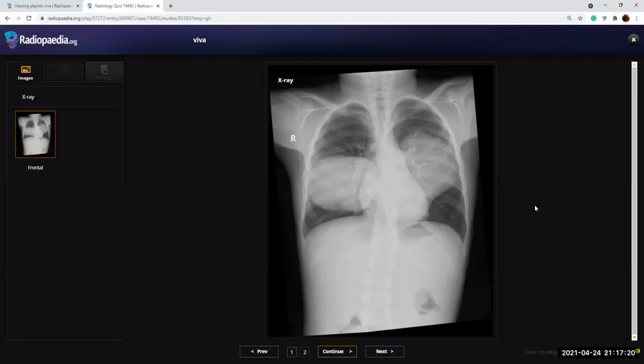Okay. So this is a frontal radiograph of the chest of an adult patient who has been on medical treatment for some time. I can see opacity in the bilateral mid zones with well-defined superior and inferior borders, and I can also see that the opacity is overlying the cardiac shadow, but the cardiac shadow can be separately seen. I can also see the hilar vessels through that lesion, and there is no rib widening. I can also see some lung through that lesion.